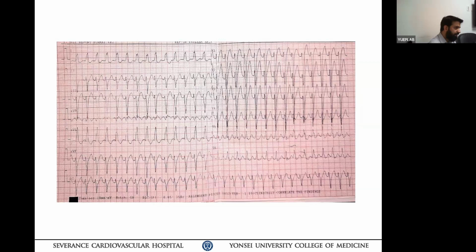I favor SVT with aberrant or fixed bundle branch block. Typical bundle branch block pattern. There is no definite AV dissociation, and of course, Oyundari pointed out the different QRS morphology. However, some other mechanisms can be involved except fusion beat.